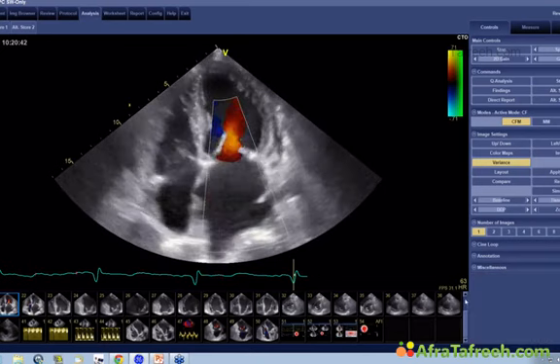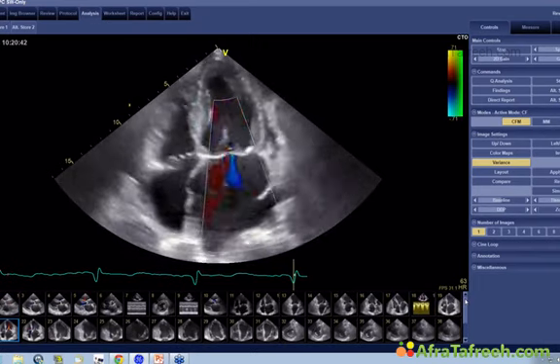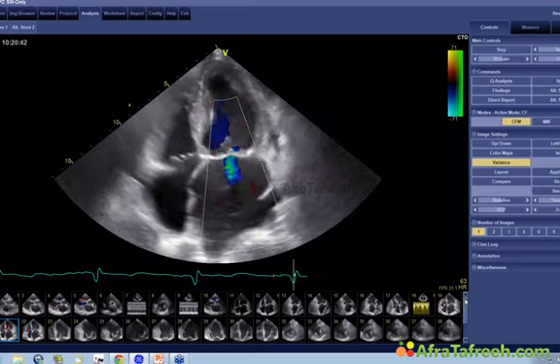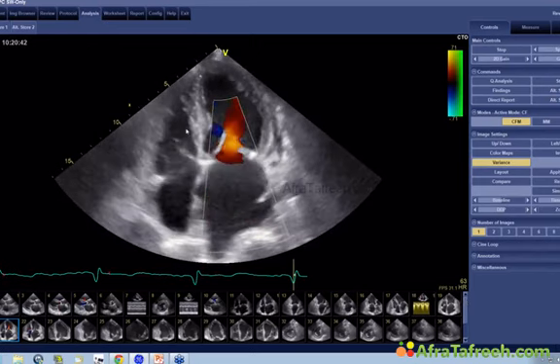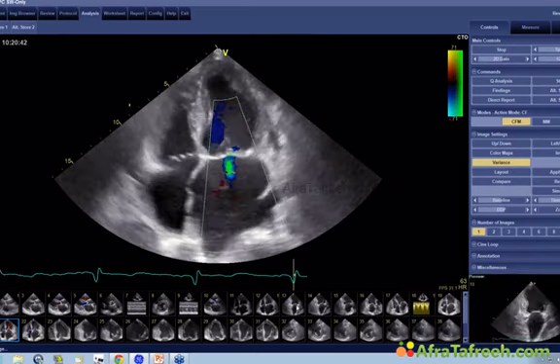Okay, just to put this case together. What does this mean? The patient is old. The patient has cardiomyopathy, maybe burned out hypertensive heart disease. We cannot exclude coronary artery disease. Obviously, this might also be the case because the basal inferior septum, as you can see here, and also the basal inferior wall was a bit reduced.